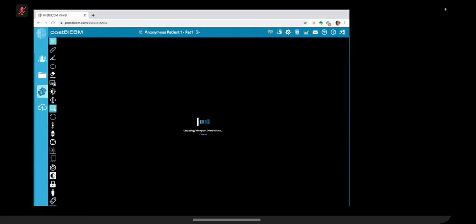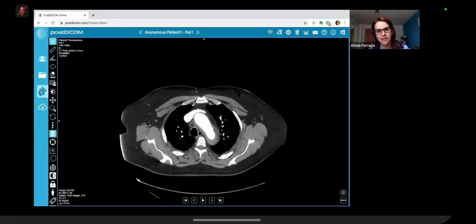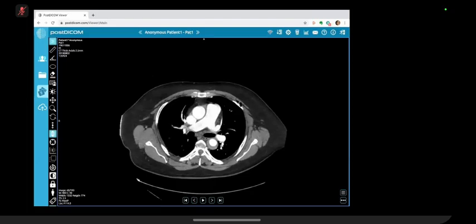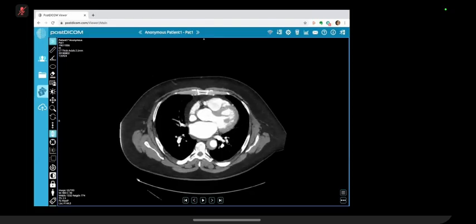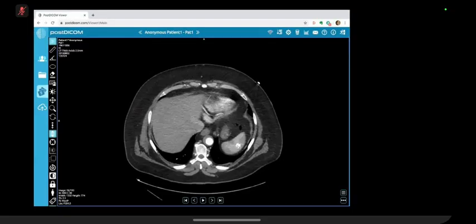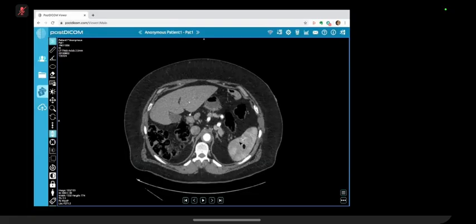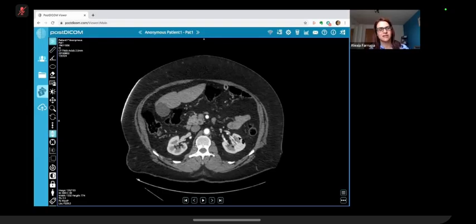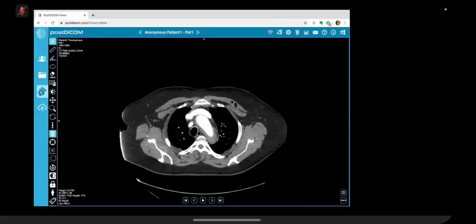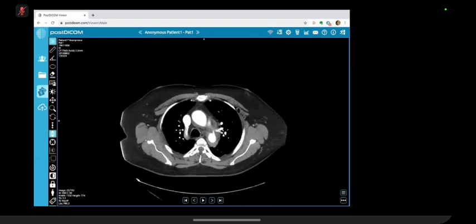I'll show you an aortogram now, an arterial phase scan, which confirms your suspicion. Yeah, there's quite circumscribed mural areas of hyperdensity, not having contrast there. So the wall is thickened and there's a hematoma there. For your diagnosis? Intramural hematoma, acute aortic syndrome, and the fat's a bit stranded, but I don't think it's ruptured there or there's any ruptured plaque.